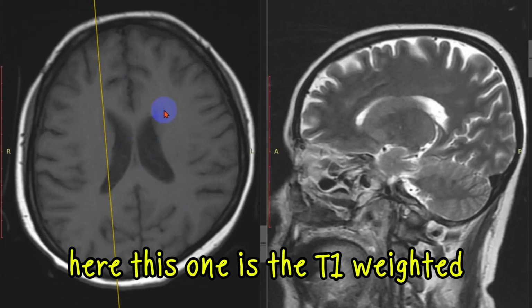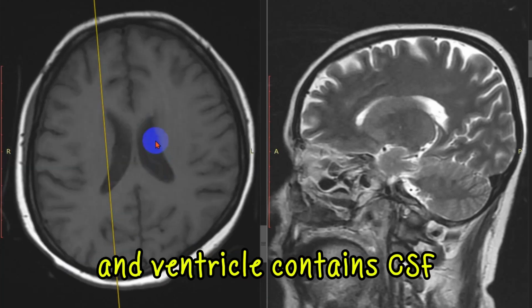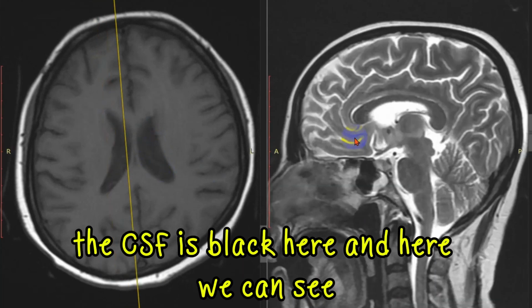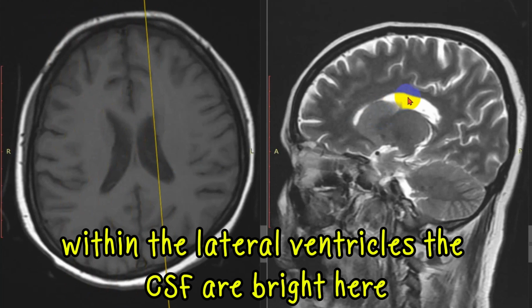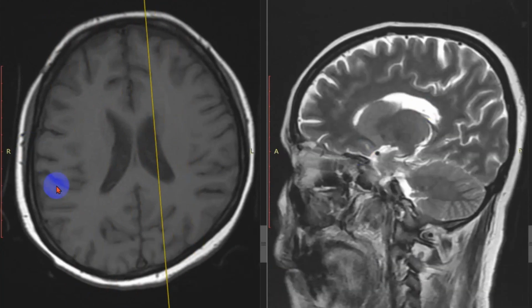Here this one is the T1 weighted. As we can see, this is the lateral ventricle and the ventricle contains CSF. The CSF is black here, and here we can see within the lateral ventricles the CSF is bright. So this one is the T2 sequence.